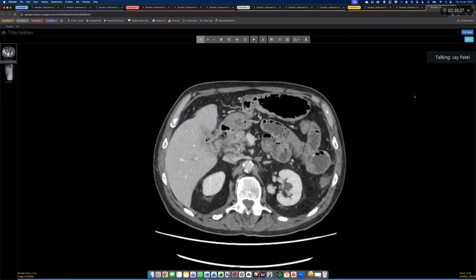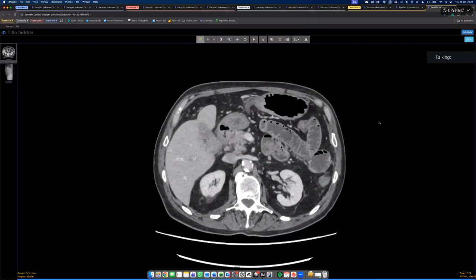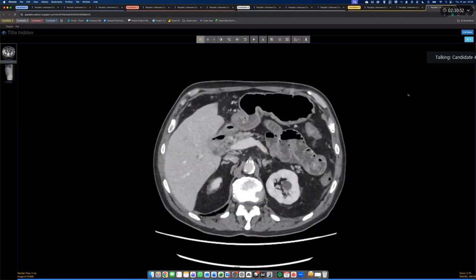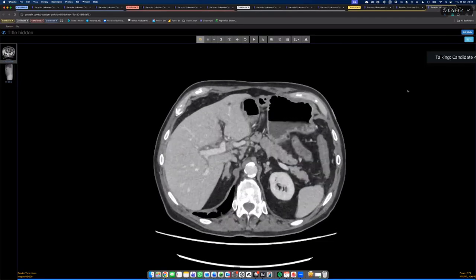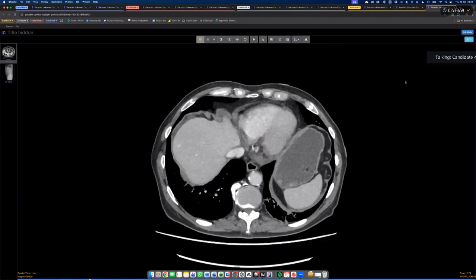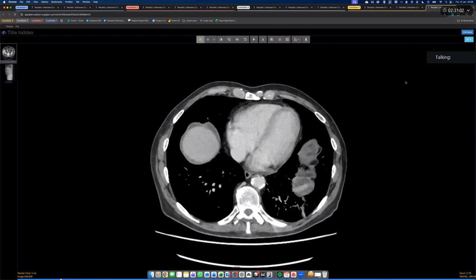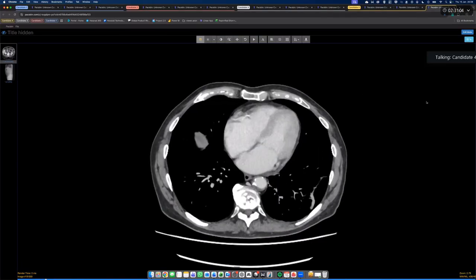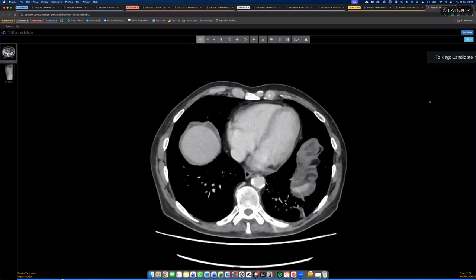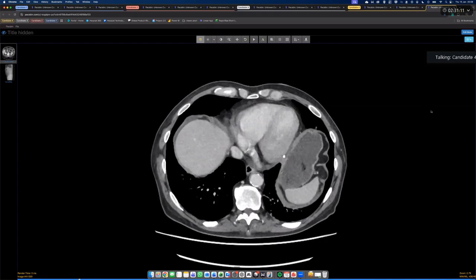This is an acute abdomen. Patient presented with vomiting. Okay, so I have been presented with axial CT images of an abdomen. I'm starting from the top slices. Shall I start from the chest images? You can just start there and work your way down. Correct. Okay, so I'm looking through the images. The patient is presented with a complaint of acute abdomen.